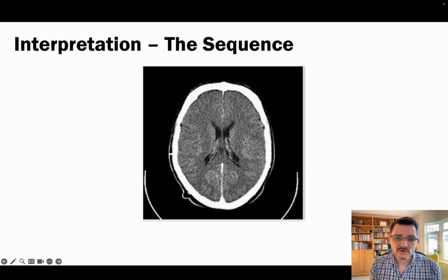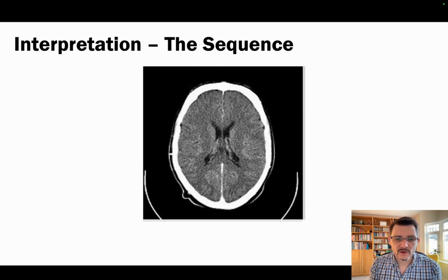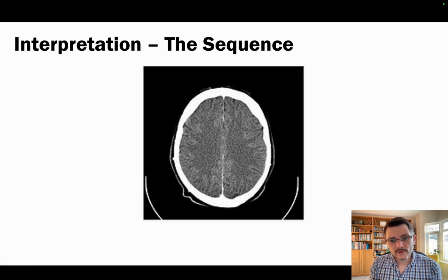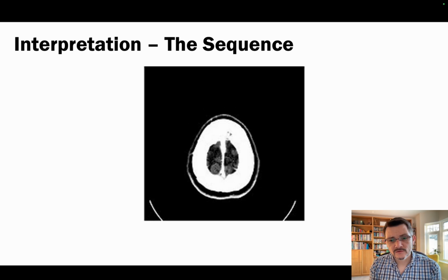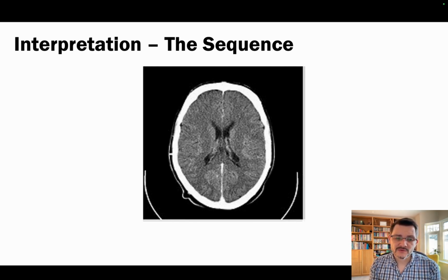And you've got your insular cortex, not visible yet in these slices because this person's a bit younger, but it'll be in this sort of region, which has a little snake-like appearance. And then you've got your caudate head and basal ganglia in this region as well. So if we keep progressing upwards, all that looks nice and healthy. You can start to see as you get to the crown of the head now, there's a bit more CSF space on the outside, and that all looks appropriate. So that would be my way of starting to progress through a CT scan.